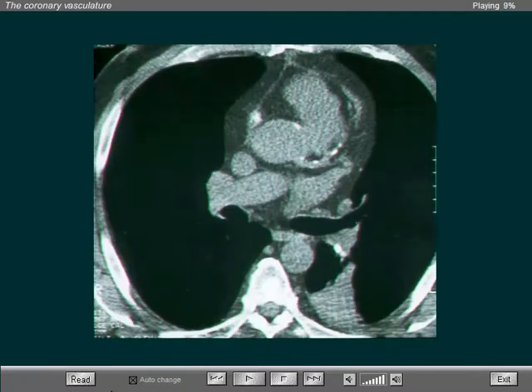In this patient, in addition to heavily calcified coronary arteries, one can see a triangular density behind the left hilus, close to the posterior chest wall, which represented a pneumonia. The adenopathies seen in this patient in the vicinity of the left perihilar region were due to sarcoidosis.